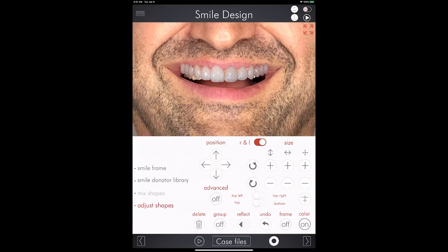If we work with natural smiles, they are not perfect, not symmetric. They have these beautiful imperfections for the smile design, and we need to work with all these little details that create the smile in the natural way. Now, as you can see, the centrals are a little bit different. So now you have to decide which form of the centrals you are going to use.